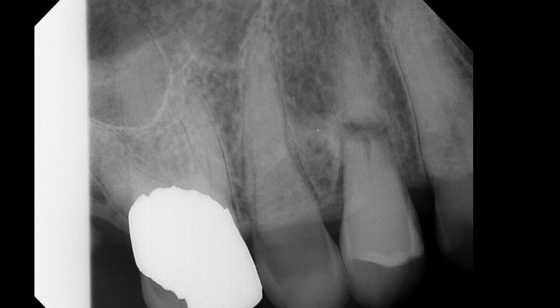What's interesting here, although this is not an anatomic landmark necessarily, is tooth number, let's see, it looks like number 5, has sustained a root fracture, a horizontal root fracture. You can see that there is a radiolucent line extending from one side of the tooth all the way to the other side, and there's a little bit of widened PDL space. This could represent early periodontal disease and bone loss.